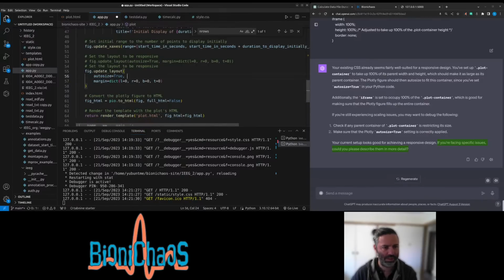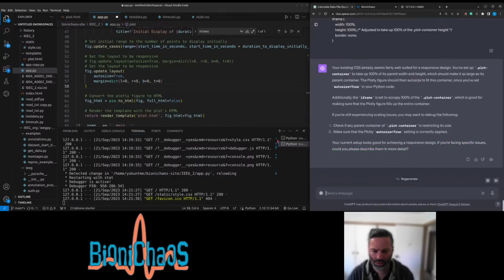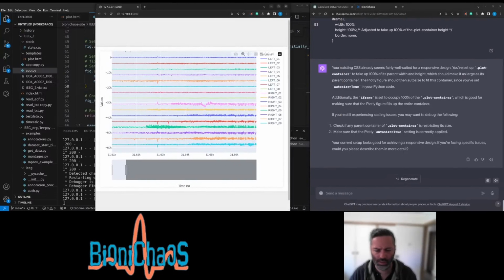Yeah, it just generally doesn't look good. Yeah, I want to do quite a bit of it. Want to remove, probably remove background. Let's pop it in another window for a sec.